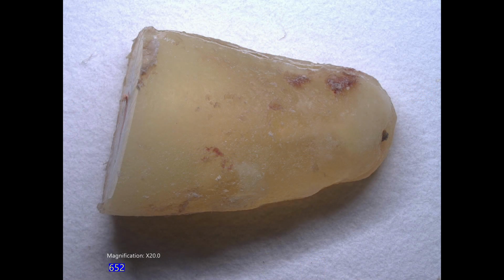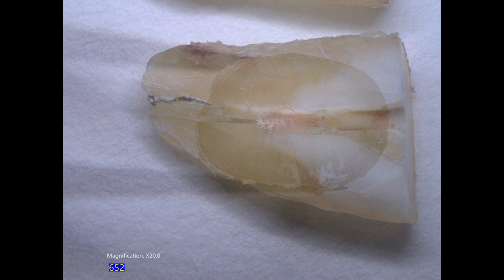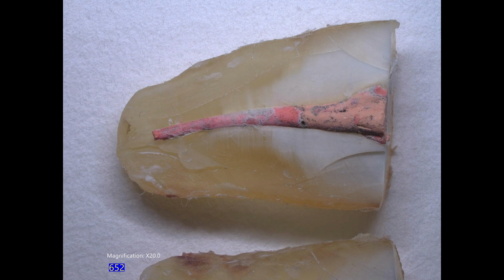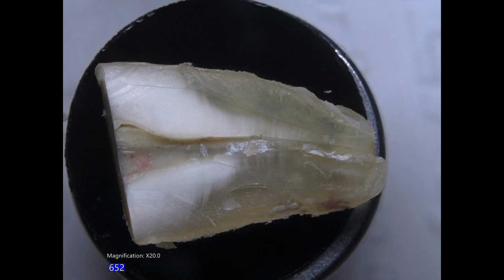When I got the tooth, I didn't see a vertical root fracture. I sectioned it sagittally, as is our method, and got a pretty good look at the root. Got two fairly good sagittal sections, not perfect, but enough to examine the canal. I was able to tease the gutta percha out. So after they were dehydrated and dried, these are what the specimens, the two halves, look like.